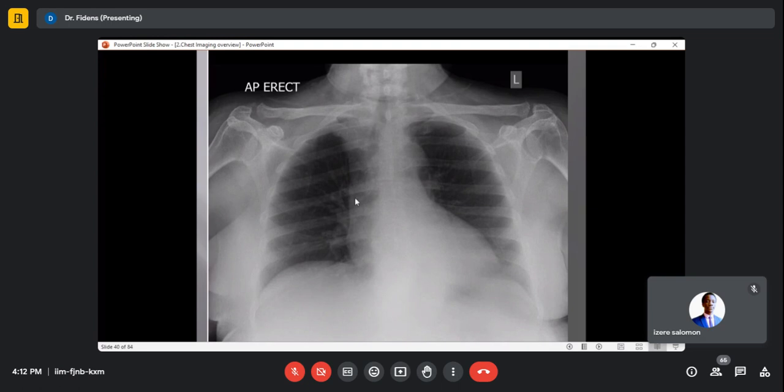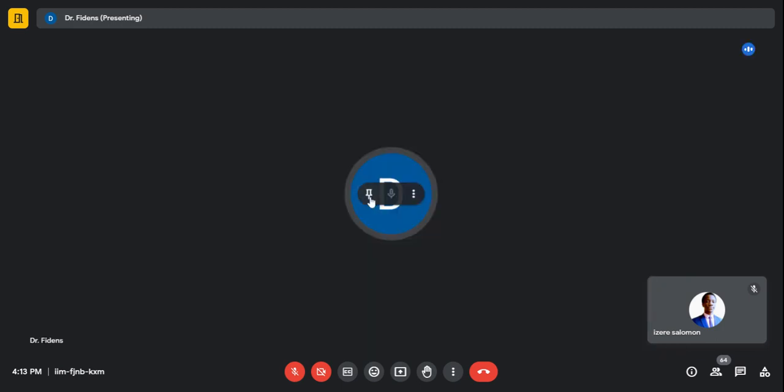The heart, the mediastinum is magnified, but that was not our intention. We wanted just to see the apical regions of the lungs to see if there is any opacity or not. Okay? That's the view. We don't care about the other part of the lungs, like the base of the lungs. It is a supplementary or complementary view. Okay? Yes. Okay.